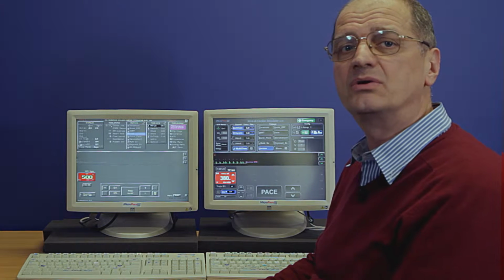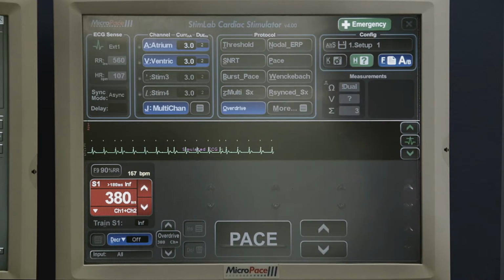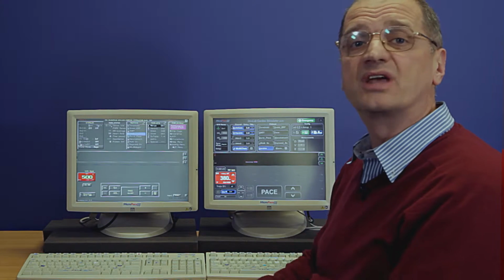Hello, my name is Dr. Marko Sejnar, and this is a Micropace instructional video to introduce our new software 4.0 version on the right, which is an update to the software 3.21 cardiac stimulator software, which has been in the market for some years.